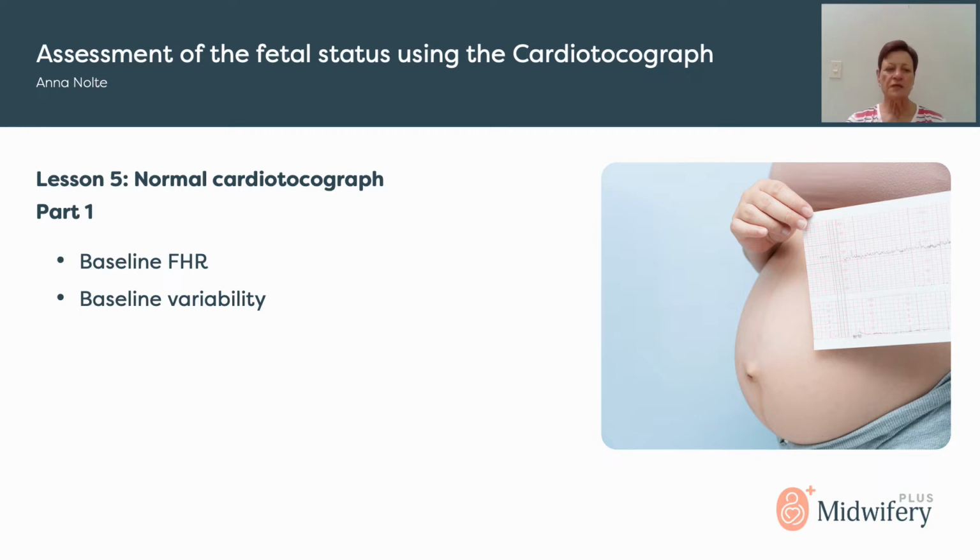So in this part, we're going to talk about the baseline of the fetal heart rate and the baseline variability. In part 2, we will talk about the accelerations and decelerations and the contractions, and also a little bit about antepartum fetal heart interpretations.